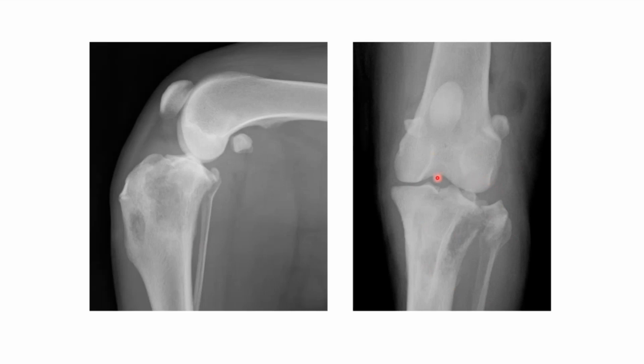So our conclusion is that there is a monostotic aggressive bone lesion affecting the lateral aspect of this proximal tibia, and there's an associated, what's likely to be, pathological fracture of the right tibial epicondyle. And this lesion was indeed neoplastic, but actually this was an example of metastatic bone disease. So this patient unfortunately had a primary ocular melanoma that had metastasized to its proximal right tibia. So that's a nice example of an aggressive bone lesion secondary to metastatic bone disease.